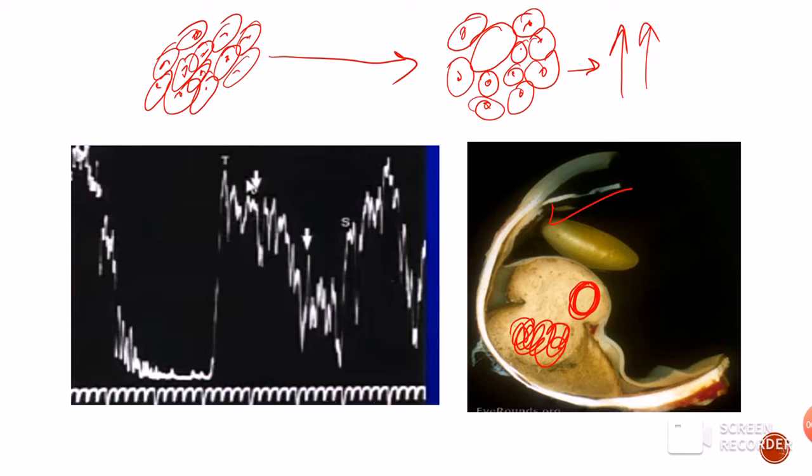So what I want you to remember is that when this is a dense structure, we get low dense echoes because of the low internal echoes, and whenever the consistency varies because of necrosis and cystic changes, even a low dense melanoma can give high dense echoes.